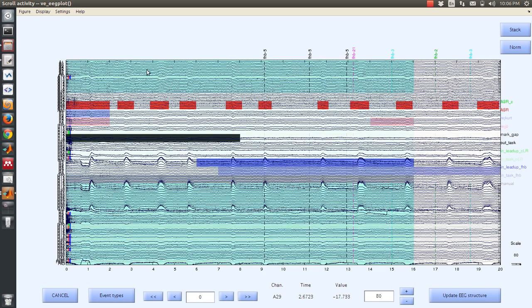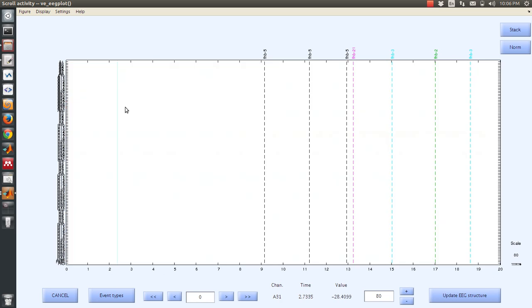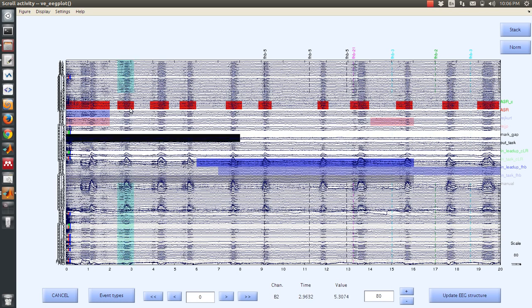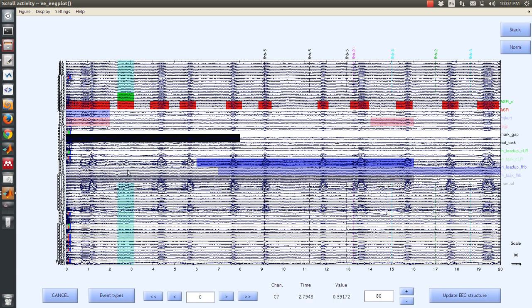Now, what I can do is select a period of time. And actually, let me just remove this background for a second. So I can select this annotation, and now that this annotation is selected for a period of time when the ASR showed a difference in the clean data and the original data, I can press C on this period of time, and it will overwrite the original data with the new clean data. So we can see that during this period of time, it cleaned the data, removing the old data.